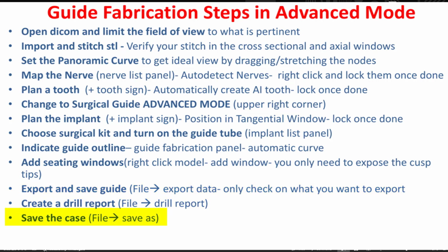So you notice that it's all of the same steps that we did in the wizard mode, but again, the challenge for people in advanced mode is it's not intuitive to them that they need to follow this process. And you could do these in different orders, but I find that this is the best way to approach a case. This is how I do every single case when I do it.